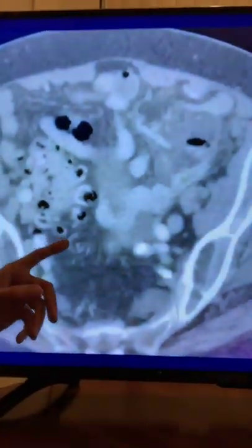So we talked about the hiatal hernia. Sliding type, paraesophageal type, you can have different organs, not just the stomach going up into the thorax. We have mentioned in the past, I showed you guys an image of a retrocardiac opacity that I wanted you to make sure wasn't actually the heart, some sort of abnormality. It wasn't pneumonia. And then I gave you a lateral view, and you actually saw it was legit retrocardiac. It was right behind the heart, and it was kind of this bubble. And then you see an air fluid level. That's diagnostic of a hiatal hernia, a large one sitting behind the heart. If you haven't seen that case, I can post it again, but I believe it's in one of my prior videos. Check it out.